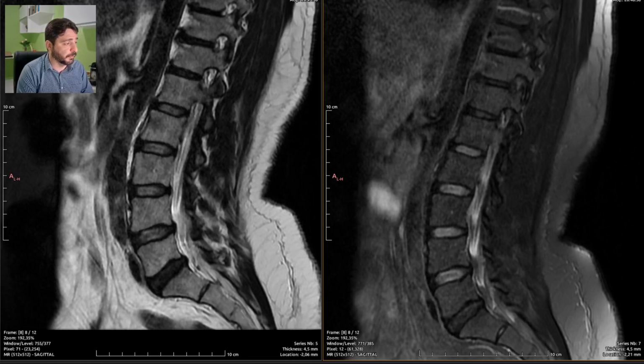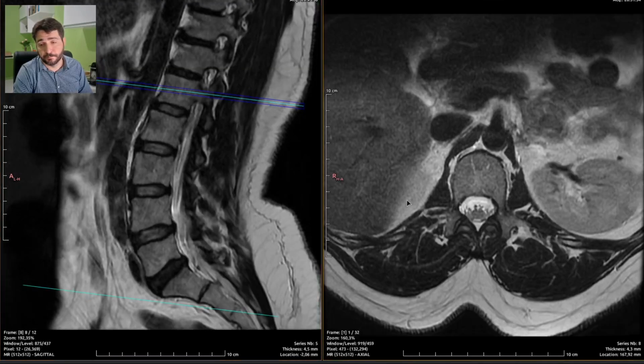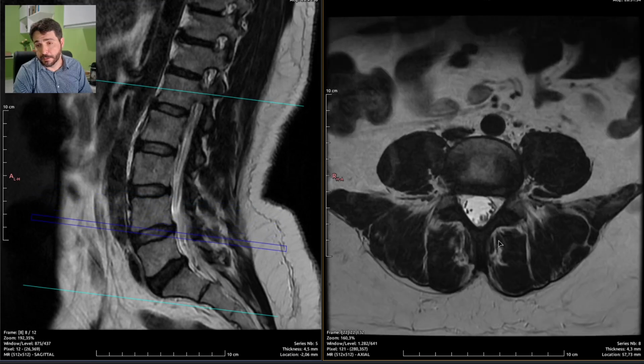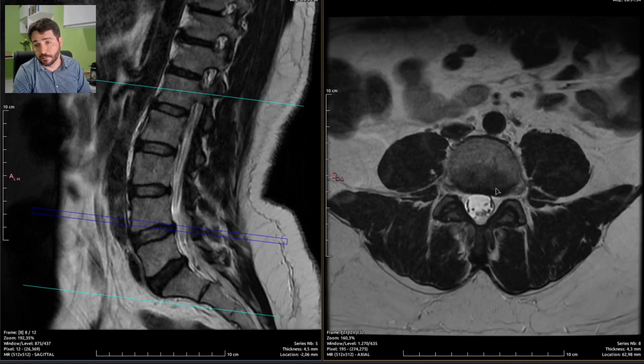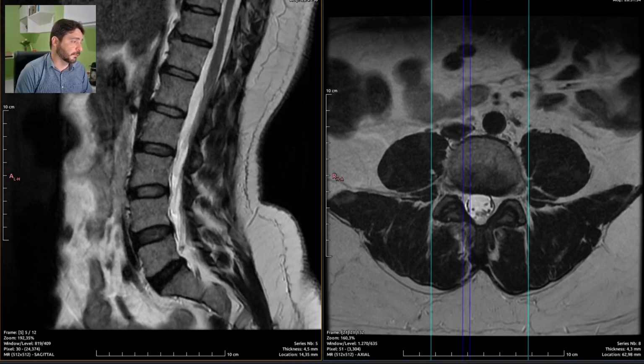Also on L4, L5, but they are bigger and larger, much easier to see. So they are right there. Yes. I'll just group together L4, L5 and L5, S1.